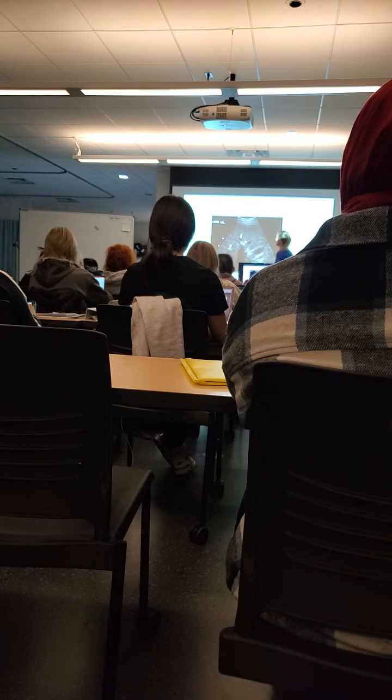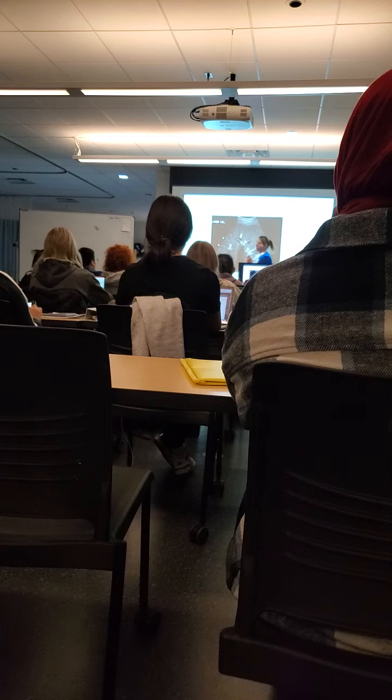And this is cholelithiasis within the liver. So these are ones that are formed within the liver. And so you can see they're very small, and they've got that shadow. And so it might be like, what am I looking at? Is this pneumobilia? No, because it's not a gas shadow. It's a black shadow. So we know that it's stones.